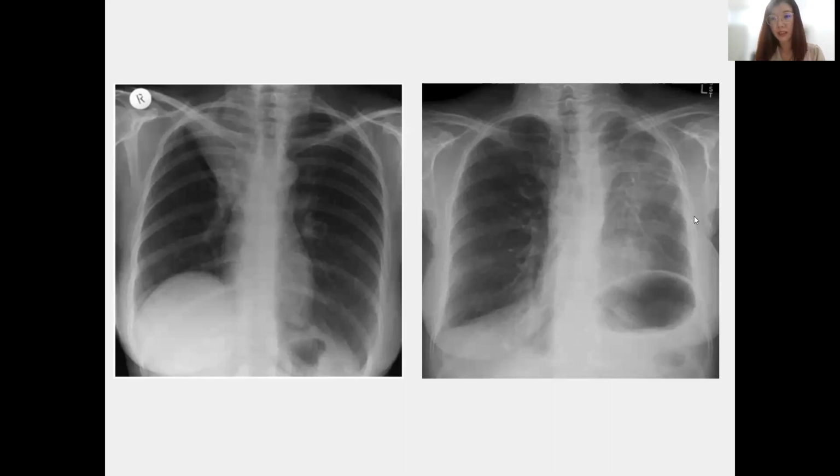Easy one. So the X-ray on the left-hand side, we do that first. Do you see my arrow? You can see my arrow pointing, right? Yes. So we have answers coming in. These are the easy ones. Everyone can answer.